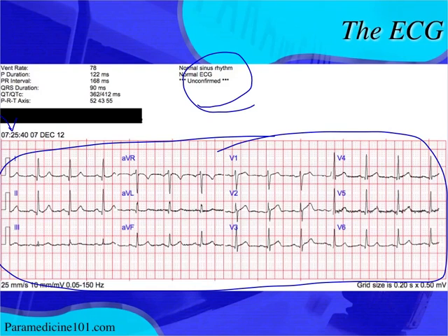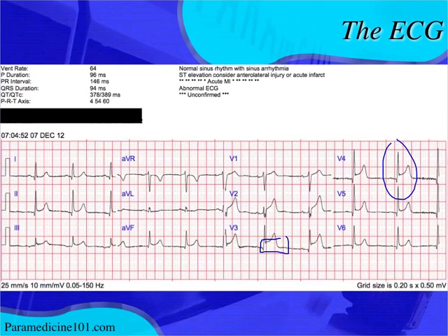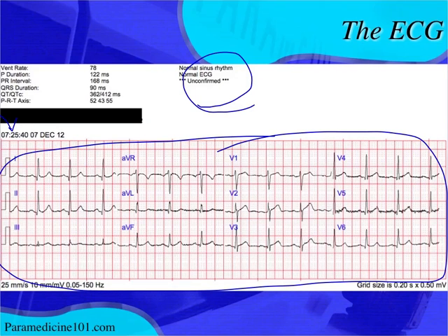This one was at 7:25. This is the second one. And the first one was at 7:04. Okay, so that isn't a big amount of time, but I believe that there were a couple in between these. I said this is the second one, but I think there was another one in between this that was much earlier that looked a lot like this second one here. And it was within a few minutes after the first one, after they gave the nitro.